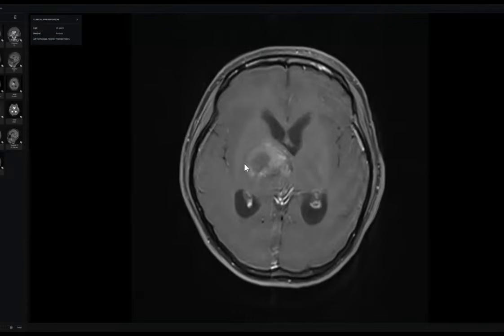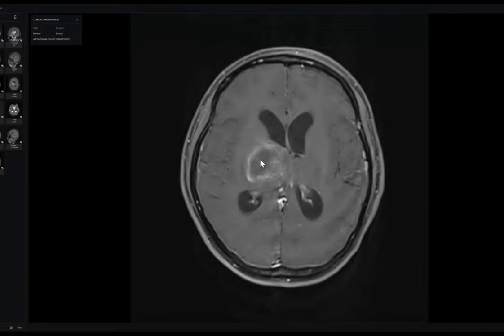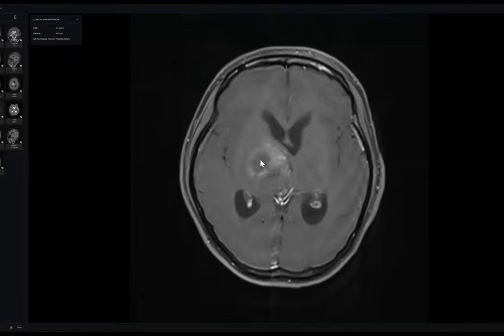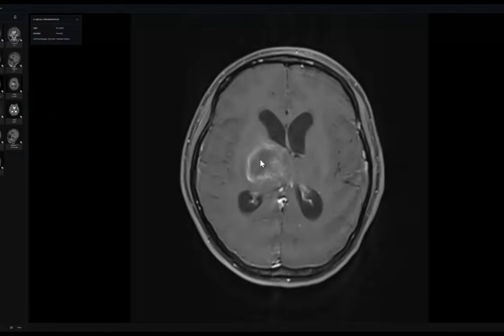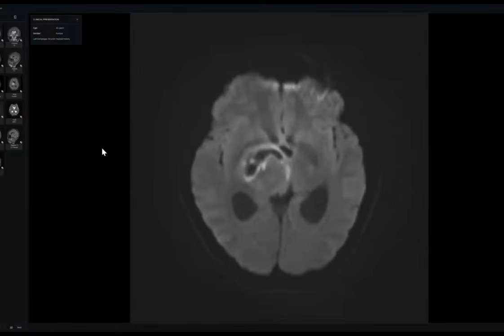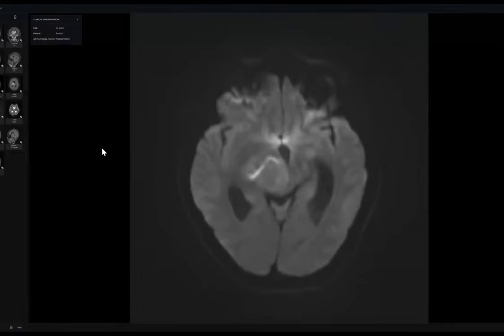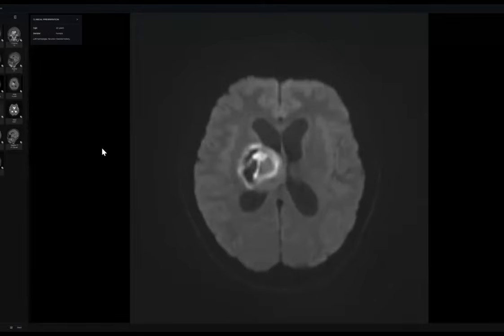Any hematoma may be surrounded by some inflammatory changes and may show this ring-like inflammatory hyperenhancement. Where is it? Do you have any solid component here? Yes or no? No, I do not see. Are you sure? This is the diffusion. Yes, the diffusion shows some areas, maybe the internal septa, that show restriction.